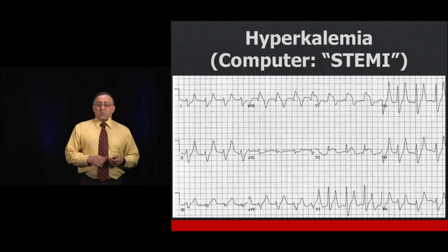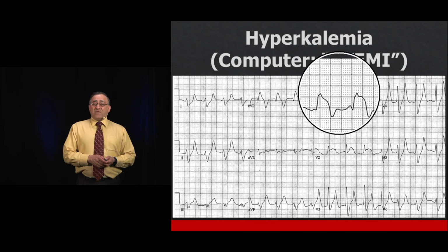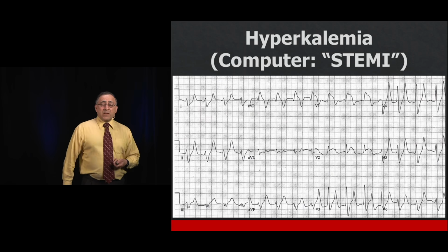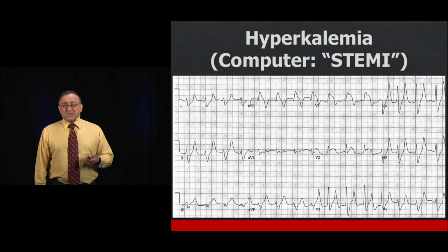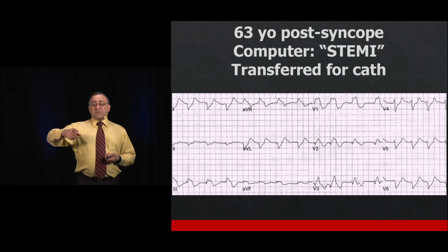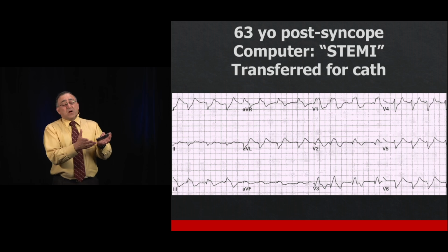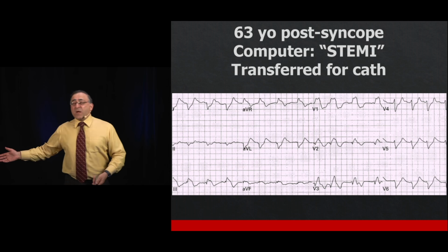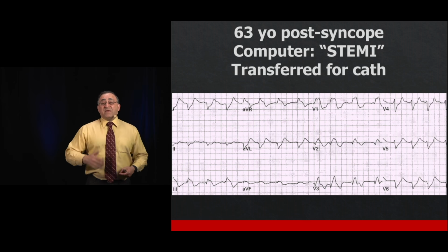All right, here's another one. The computer called this a STEMI also. ST elevation in V1, V2, aVR, and a rightward axis. That's hyperkalemia as well. And yet another one. This patient actually was misdiagnosed as a STEMI because the computer called it a STEMI. The physician at this community hospital said it must be a STEMI and transferred the patient all the way to the university cath lab.